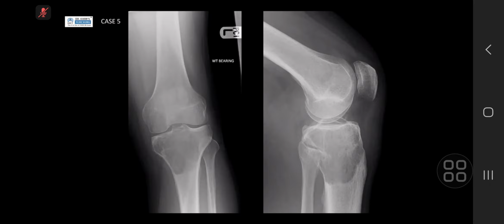So, do you think this is aggressive or non-aggressive? For this affection of the medial cortex, I think we're going with aggressive bony lesion. I'm sorry, you cut out. Aggressive or non-aggressive? Aggressive. I think we'll go with aggressive. Okay.